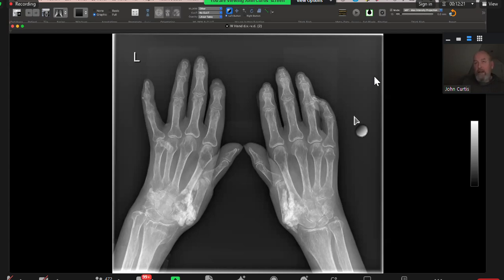Can you point it out to the audience? You may need to click before you move your mouse. Okay, so now can you see it? I can now, yeah. Okay, it's over here.